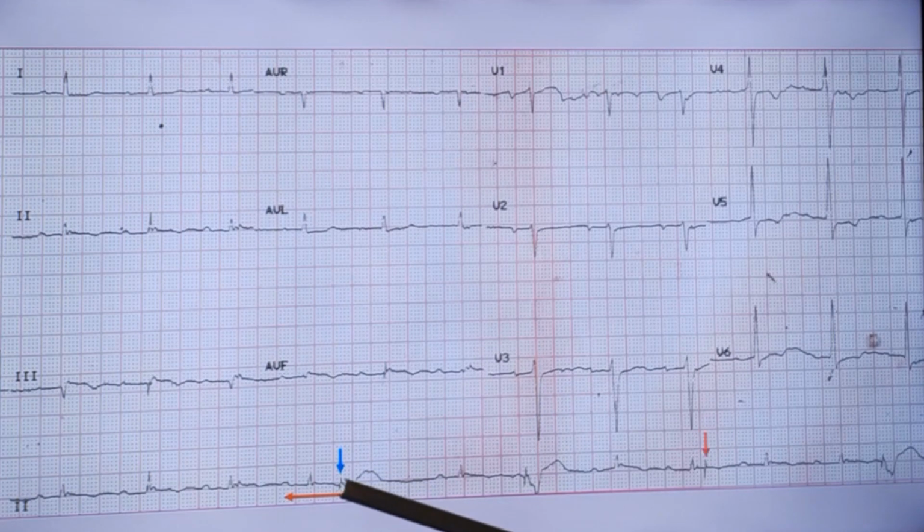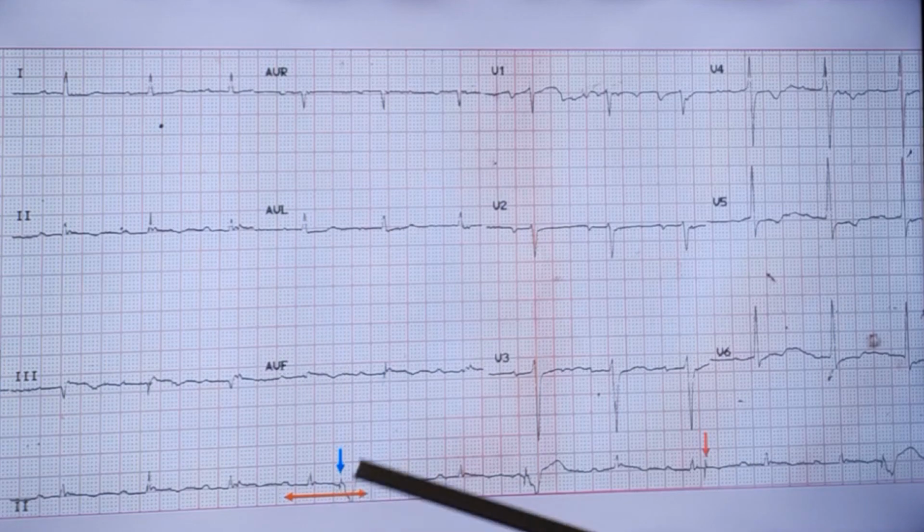The QRS has occurred because of the ventricular pacing. So it will get conducted back into the AV node also, and when it reaches the AV node, it will cause interference with the antegrade conduction of this P wave, something we call interference AV dissociation. So that is probably why the QRS is not there.